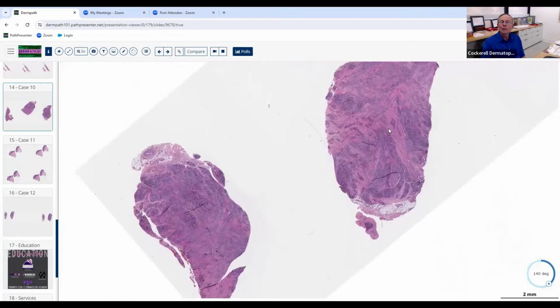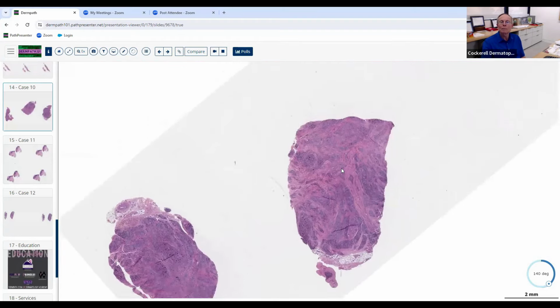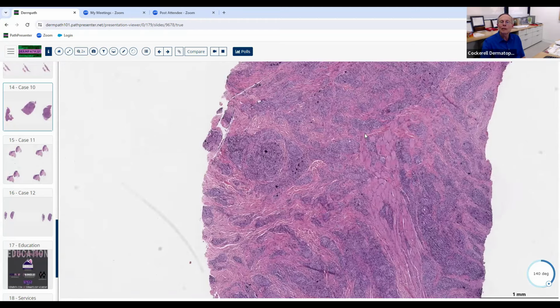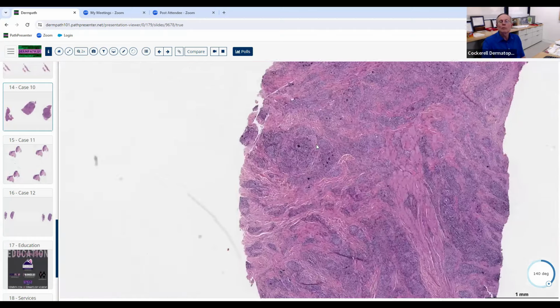basically take the tissue and it's in a block that's run across a razor blade, a microtome blade, and it sometimes will tear the skin a little bit, tears the specimen. Usually it's more of a vertical tear like this, but that's another clue that you're maybe dealing with something in there that can't be cut with a razor blade and just rips through the skin. So if you see that, that's a clue that you're dealing with a foreign body.